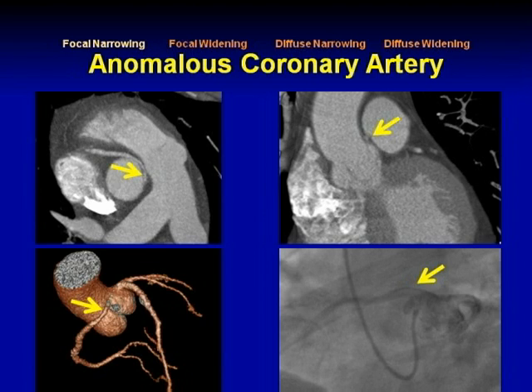You have to realize when there's a patient who comes with an incidental finding of anomalous right coronary artery, it's not always physiologically compromised. So if it's an older patient who comes with that, I either recommend a stress test. In this case, the patient had an angiography, and you can see that, yes, it does have an anomalous course, but it's not necessarily narrowed.